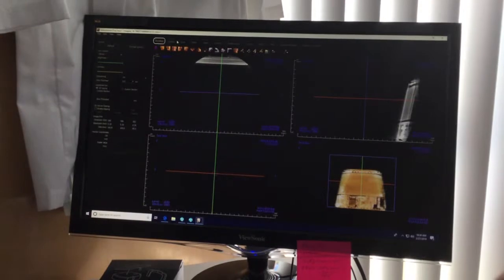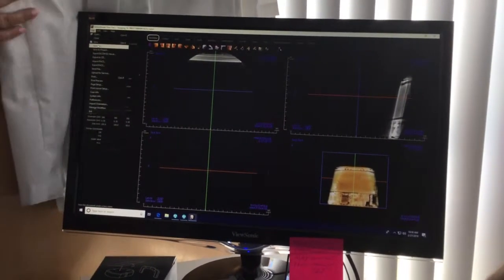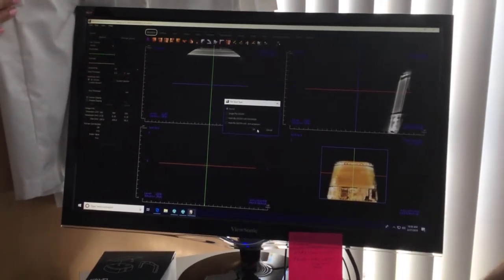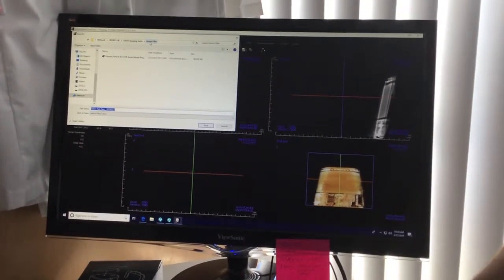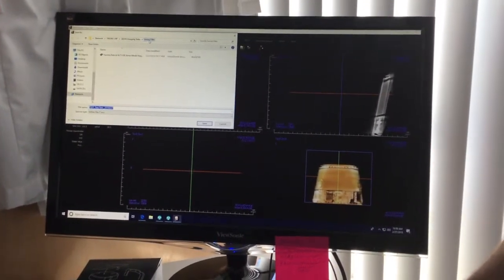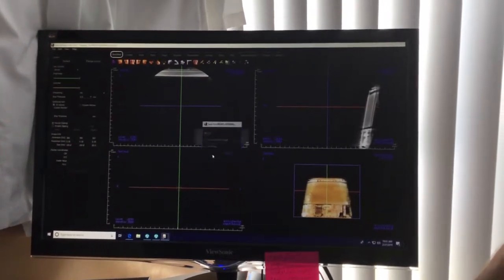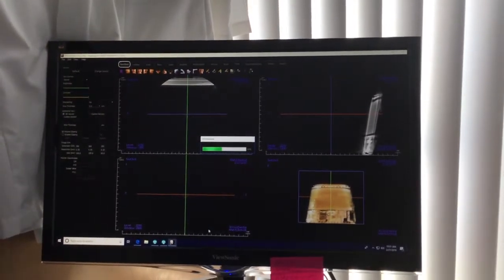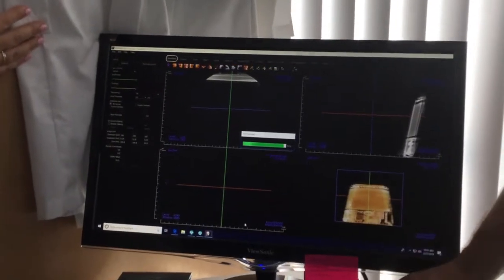So immediately once you open it, to view it somewhere else, go File, Save As, and we're saving it as InVivo because that's what you work with here. Hit OK. It's automatically going to go to this folder called InVivo Files that's listed in your network. Just hit Save. Hit Save again. Now it's saving it to your network, to the other side. It'll say OK.